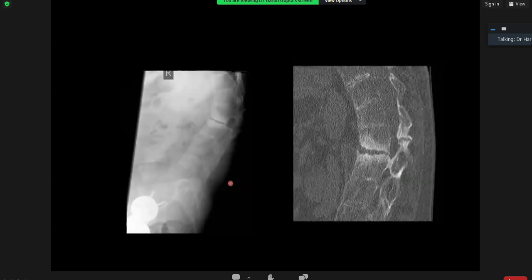This is another thing which we see commonly in clinical practice and is sometimes missed. This patient has ankylosing spondylitis. What you can see here is pseudoarthrosis developing. The patient had a fused segment, and now the fused segment is undergoing loss of fusion. There is sclerosis, the fusion is lost at this level, there is fracture across this level, and diffuse sclerosis posteriorly as well. And there is widening of the gap between the vertebral bodies. This is an unstable fracture.